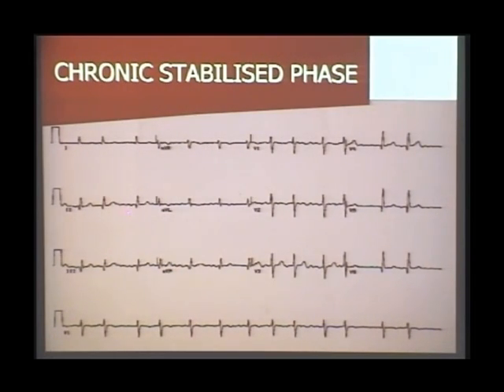So this is what happens. There is no injury, there is no ischemia. Only the necrosis remains, the scar remains. So here your job is to prevent the next myocardial infarction.